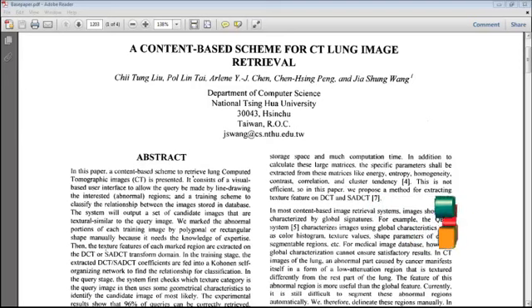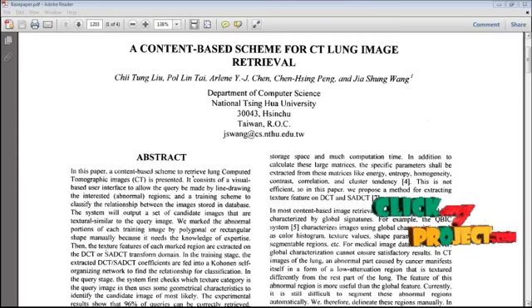In query module, from the selected query image, user selects 6 interested regions of square or rectangular shape. The features of the selected regions are extracted using moment invariance. Based on the computed features, similar images are clustered.